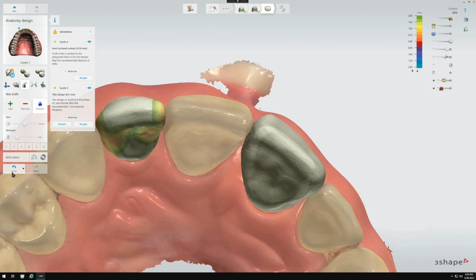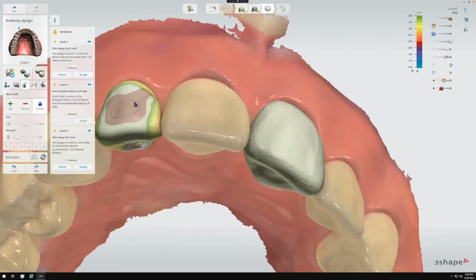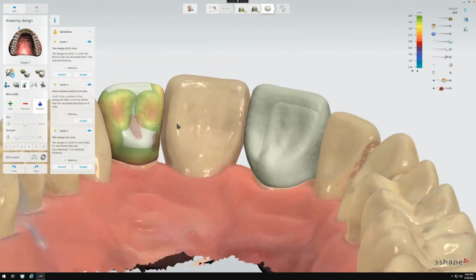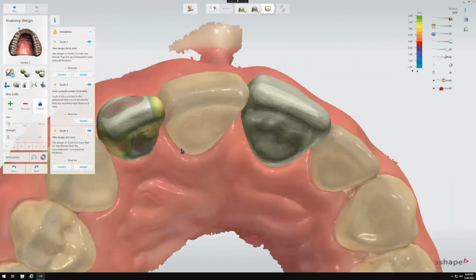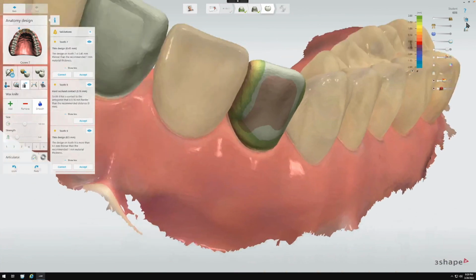So sometimes we like to choose the better of two evils, right? I would probably want something that's not super duper thin, but something that's not too thick where the patient might not like. I think we might get different schools of thought there, but that's kind of my opinion on it. But yeah, that's basically it. This is what I'm doing.